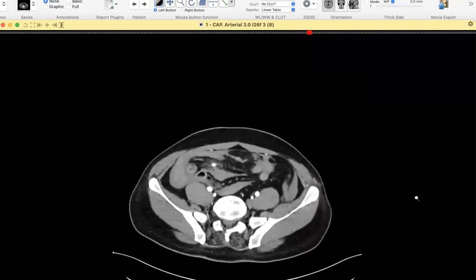All right, fine. We'll go to the discussion. And on that MRI, just in flashback, I saw some small abscesses just in the perivertebral area, afterwards when you saw it on the CT. Just in the nick of time, I was scrolling through both the cases at the same time in my brain.